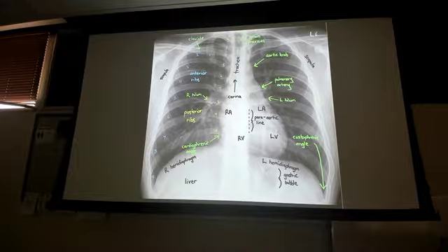And the follow-up is looking at the airways. How do you distinguish a right middle lobe versus a right lower lobe? Not on this one, but just from this day. There are two ways to do it. If you just have the frontal, the PA or the AP view, first of all, there needs to be an abnormality. That's the first thing I'm going to tell you. On a normal one, it can be very difficult. But if you have the silhouette sign, that is the first thing.